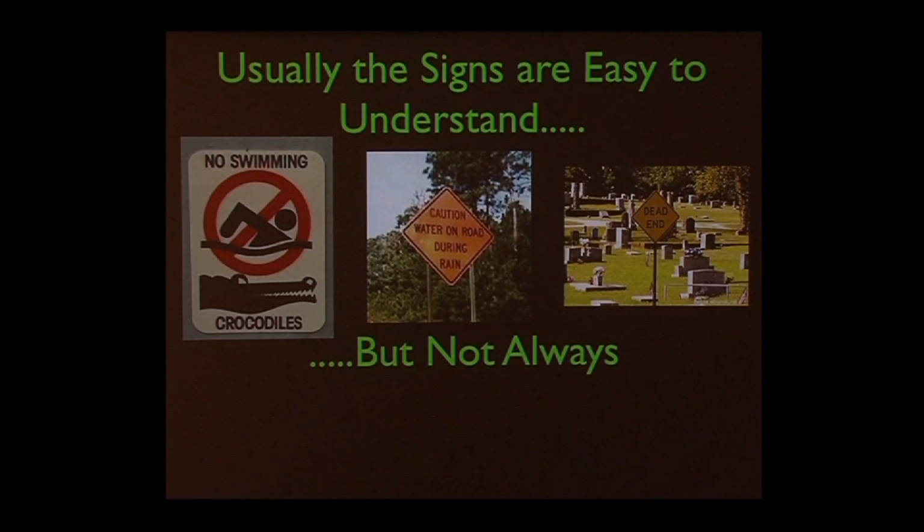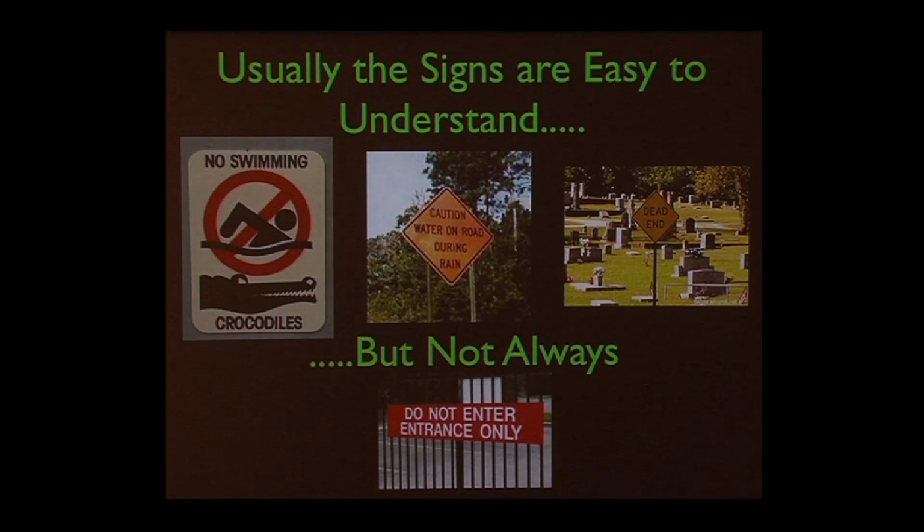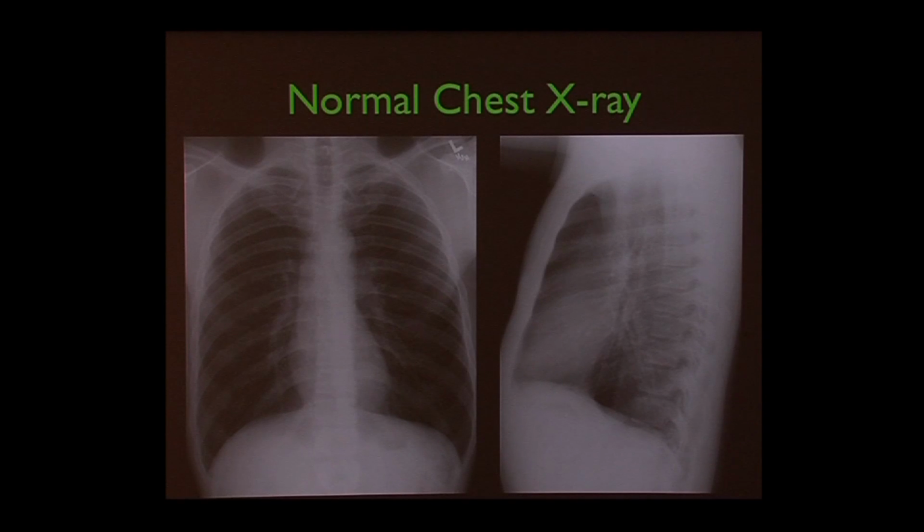Okay, so sometimes the signs that we look at are pretty obvious, and sometimes they're not. So let's go on and just talk about some of those obvious ones and some of those subtle ones. So here's just a normal chest x-ray. And it takes time to look at a normal chest x-ray.